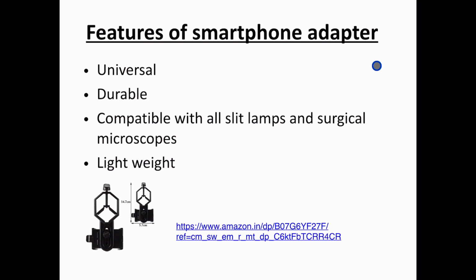It has some features like it is universal. By universal, I mean that it can be used on telescopes, microscopes, slit lamp, etc. It is durable. It is compatible with all types of slit lamps and surgical microscopes, and it is lightweight.